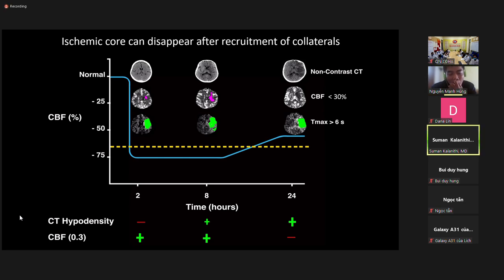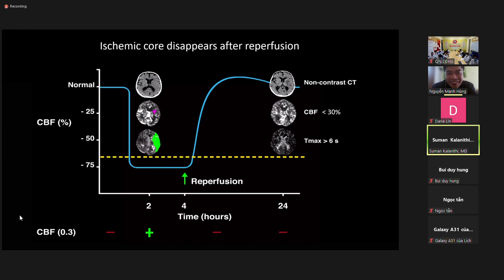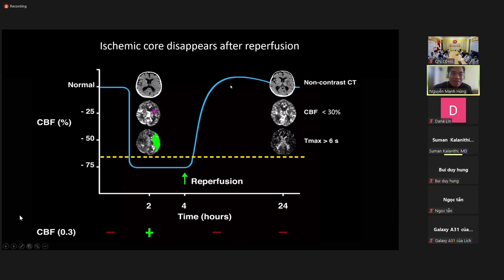Yes. So why do we do this? Yes, you wouldn't normally do this. This is just experimental. But this is a very good question. What this is meant to show you is, let's say you had a patient and they were like this at home, and they're coming to the hospital in an hour, and then spontaneously the clot dissolves, like from AFib, it just disappears. So you don't actually do this scan. This is your first scan. And then you don't even know about this. So yeah, you would never do this in real life.